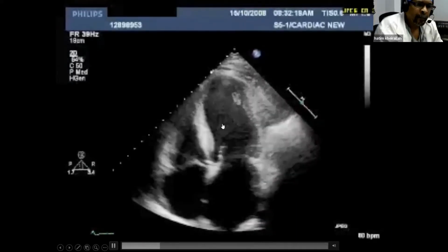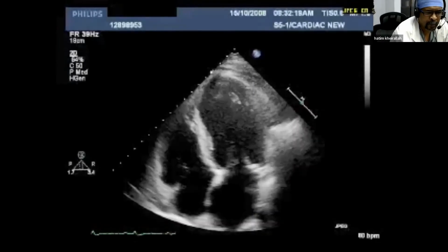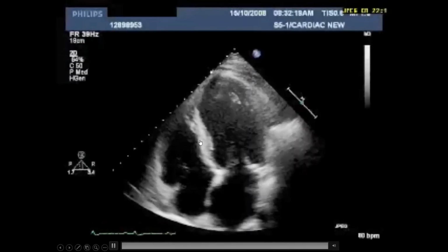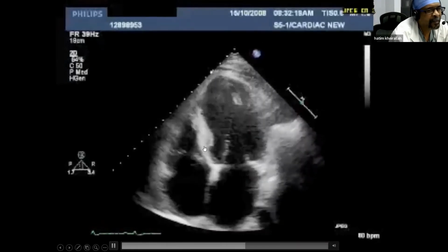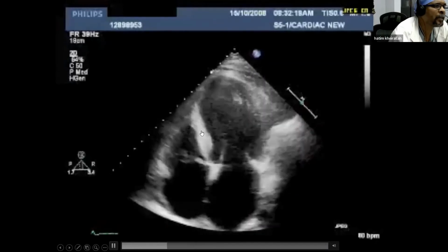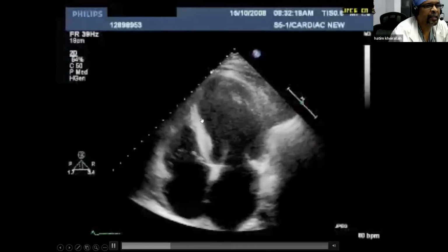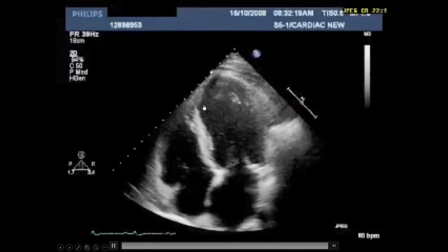Great, great. I think the majority of your description is right. This is the lateral wall, which is contracting, right? Now look at the inferior septum. The inferior septum is not contracting, maybe from the middle downward. At the base it might be contracting. So I have to mention that I have an akinetic mid-inferior septum, okay? And the apex entirely is akinetic or probably dyskinetic.